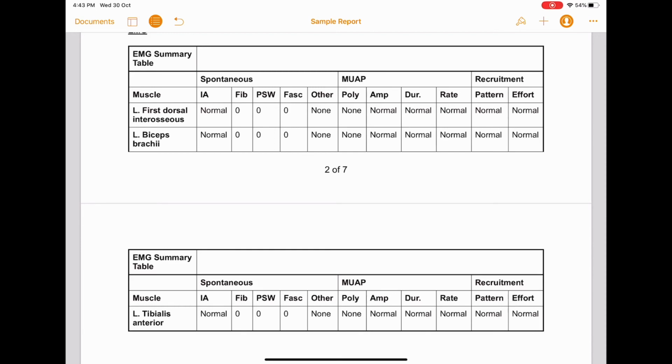And we look at that. Of note, in a neuropathic lesion, you will see decreased recruitment, which really means that because the nerve is injured, the muscle cannot recruit motor units, so it has to fire more. It has to fire at an increased rate.